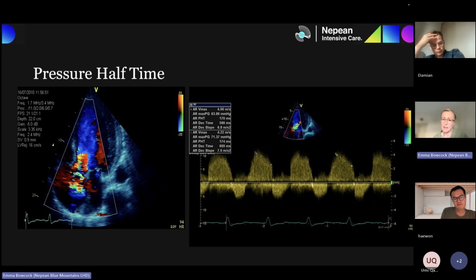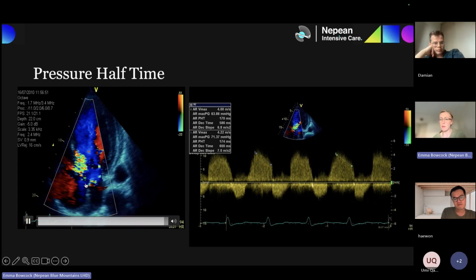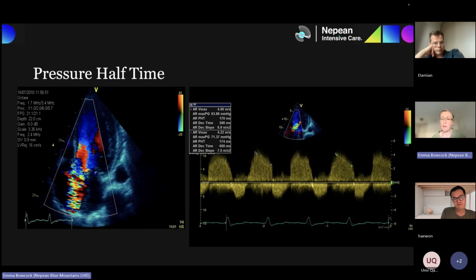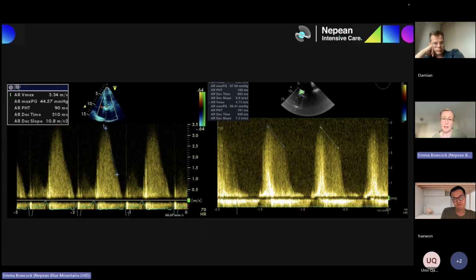It doesn't always look like the textbooks, but you get the general impression. You're putting that together with the density, similar to what's going forward, with the color Doppler, with the 2D defect, and you're starting to paint a picture of this is severe aortic regurg with all of that together. As we always say, never hang your hat on one thing, but look at the whole heart together. And it's probably chronic aortic regurg.